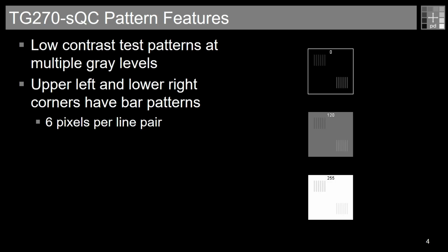Let's start with the top region of luminance squares and small test patches. The 18 squares at the top of the test pattern are equally spaced throughout the grayscale. For an 8-bit display, this means they'll be spaced every 15 gray levels. The 8-bit display value is displayed in text at the top of each box.